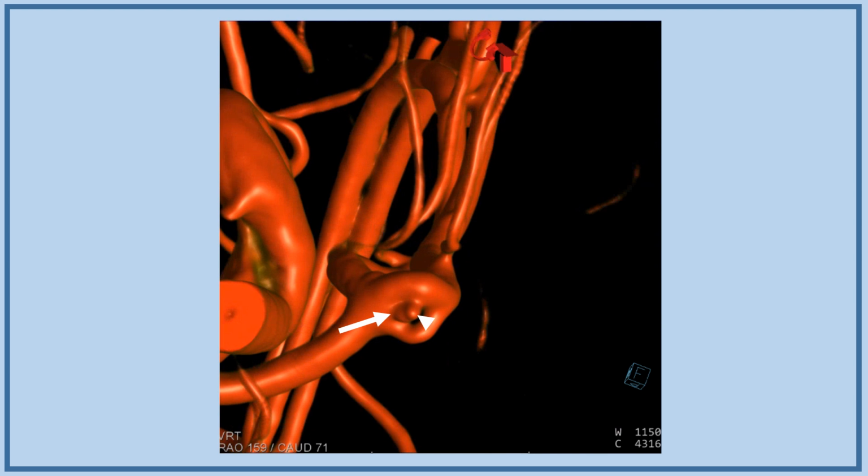Very commonly you see this kind of what we might call aneurysm proper, pointed by the white arrow. And then there's a little secondary pseudoaneurysmal component, most likely, and that's the arrowhead. That's the point of rupture. And altogether, this thing measures about, again, like 0.7 by something like 1.5 millimeters. Very, very small, right? So it's a small ACOM within a fenestration.